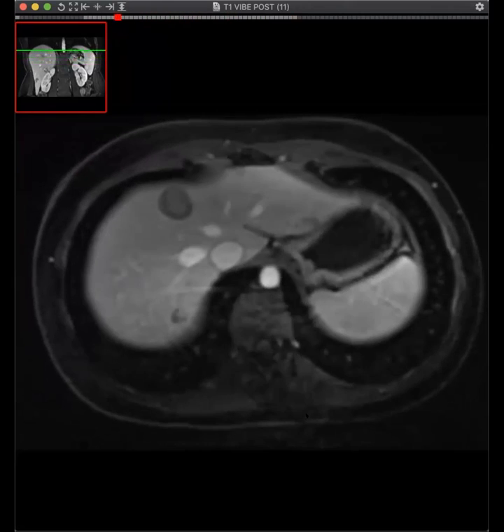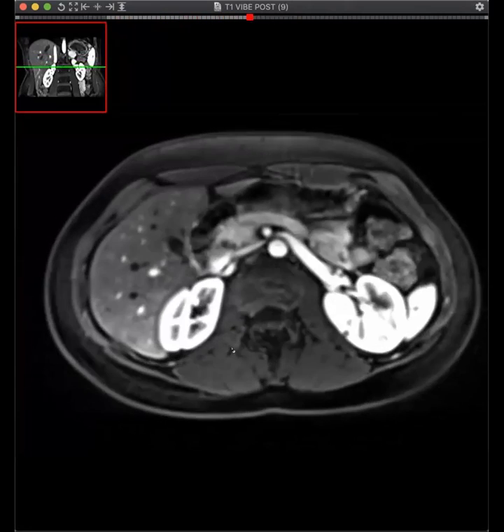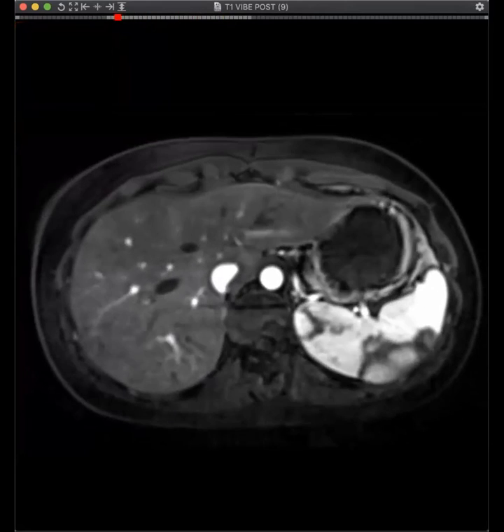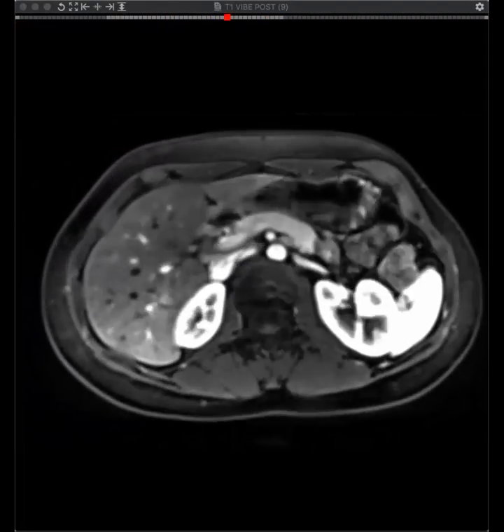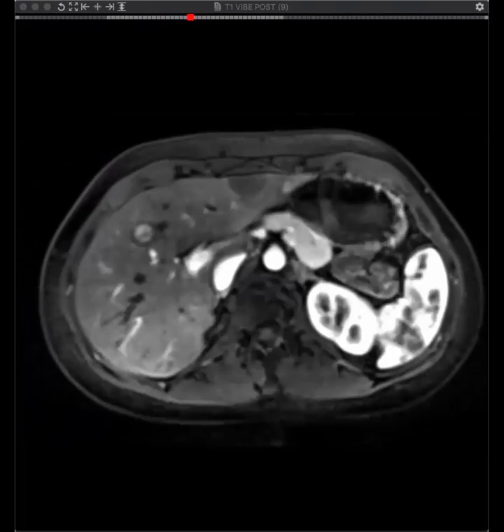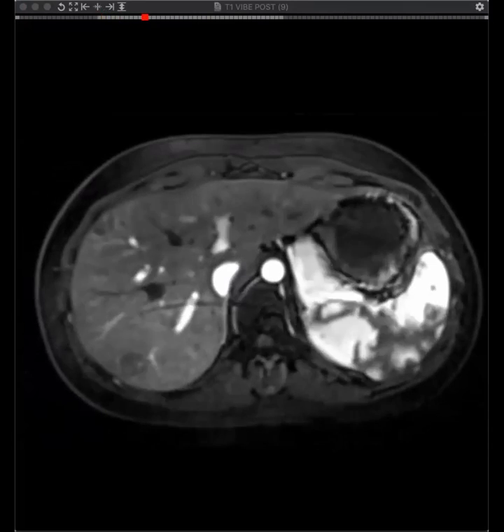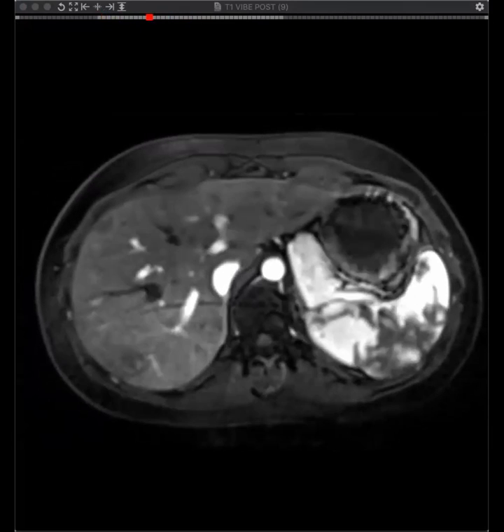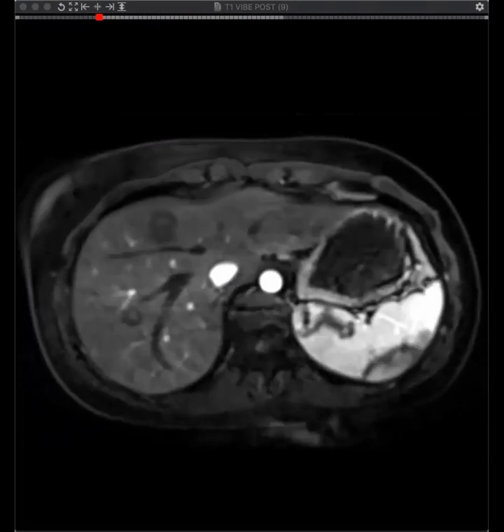Kedar, can you show us, does it change between the arterial and the venous? Yeah, the rim I have can be more delayed enhancement. So this is the arterial phase. Yeah, some people say they can mimic hemangiomas because they fill in more. But they have this peripheral non-enhancing rim. And then this is the very delayed one. So they have this typical reverse target or targetoid type of appearance, which all 3 cases we've had looked the same. And this is a very delayed scan.